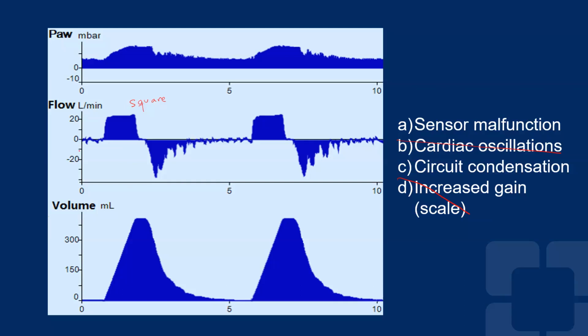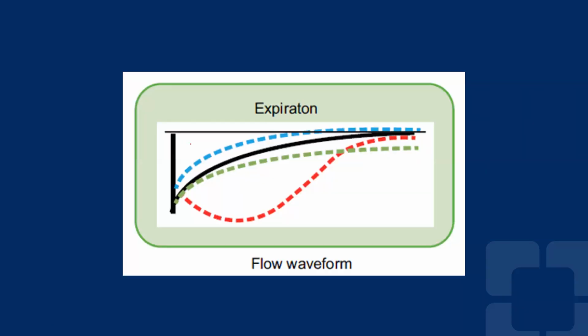The second one is the inspiratory pressure is too high. We do not see that in this case because, again, there are no features that would highlight that. It could be, but I would say that this would not explain what the arrow is showing right now. So that is not the case that explains the red arrow.